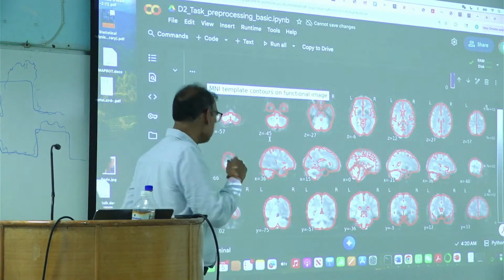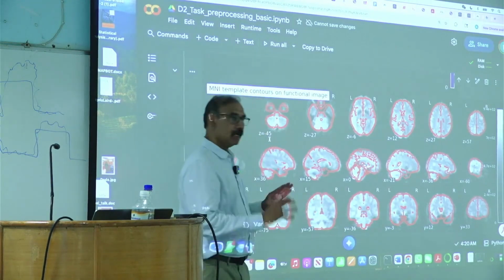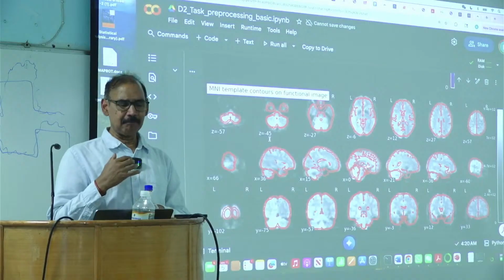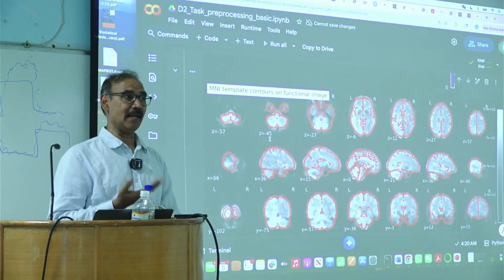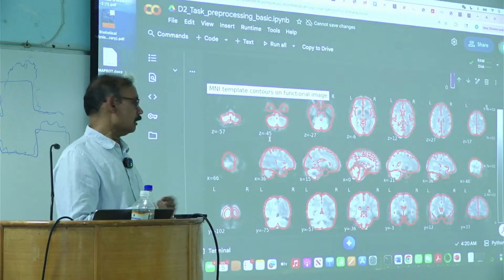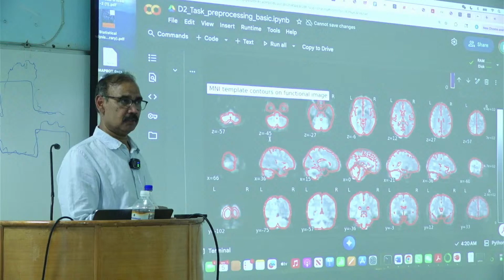Okay, so if you have some activation, let's say here, outside the contour, I would be careful, right? I would say it's very unlikely that this is real activation. It may be just specific to one or two subjects.